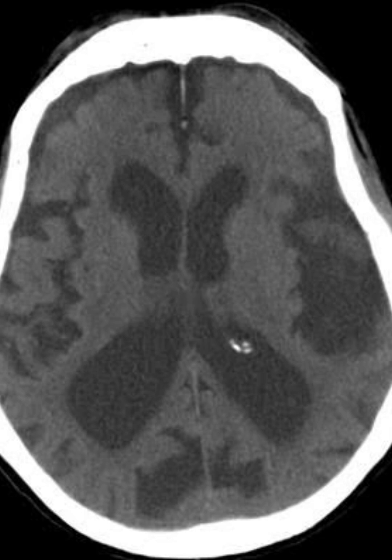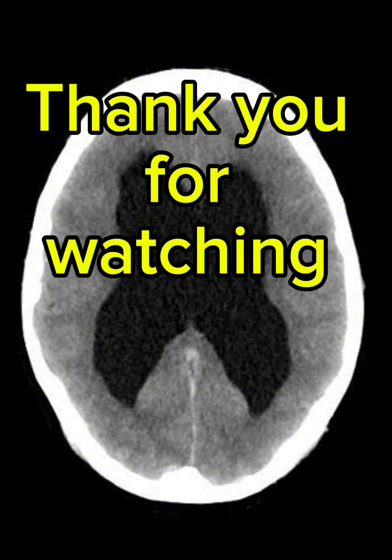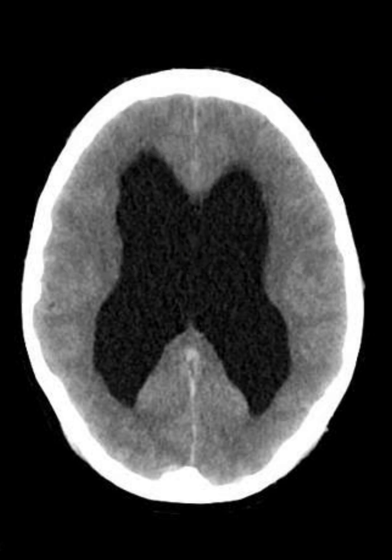On the other hand, this is hydrocephalus where only the ventricles are prominent and the rest of the brain is normal. Sulci and gyri are not prominent at all. You can see this is the CT of hydrocephalus, while the previous CT was of cerebral atrophy.